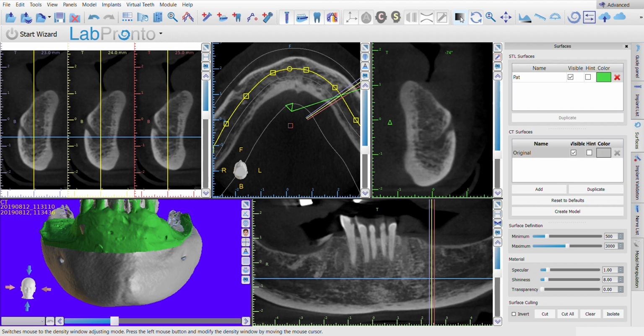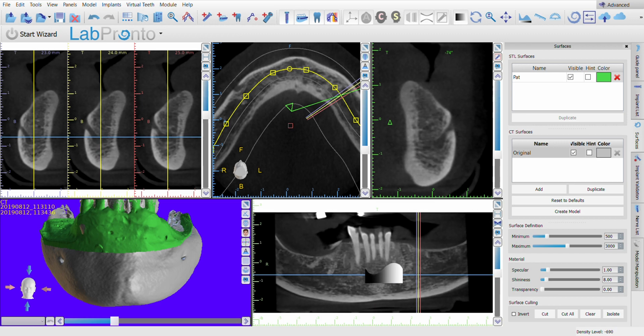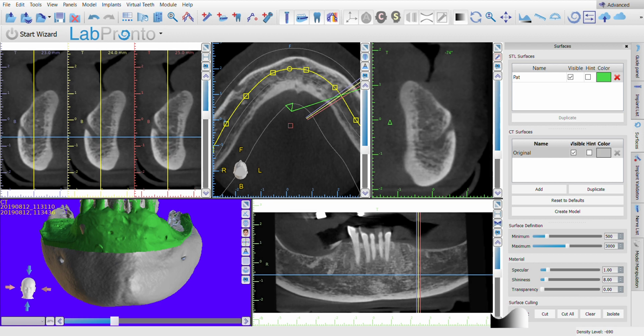You click on the gray scale, you bring it into your CBCT on any image if you wish, and you left click and go across your image, and you could see that it just got a little lighter. Now this format will not come off your mouse unless you press this button where it reverses. It's a trackball mode. You click it, and then it goes back to your scroll. It goes back to your pointer on your mouse.